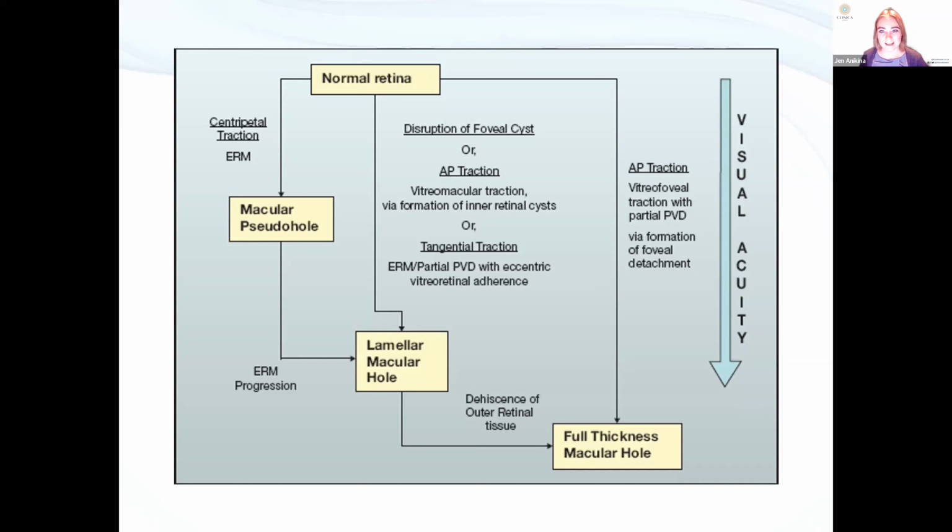That would be good. Is it normal to have hyperreflective material above the RPE in long-standing CSR? How can you differentiate from other types? Yeah, so CSR can be confused with AMD. They're both essentially fluid under the retina, aren't they? And they both get little bright bits. Again, as with so many things, it's going back to the demographics and the history. You're not going to get AMD in a 35-year-old male bodybuilder. I mean, you might, but that would be a really good case report. So it's all going back to the clinical scenario and the patient in front of you.